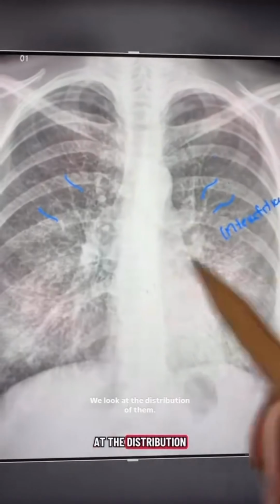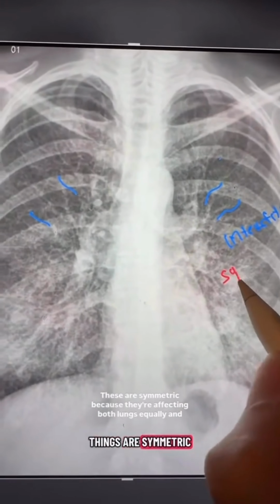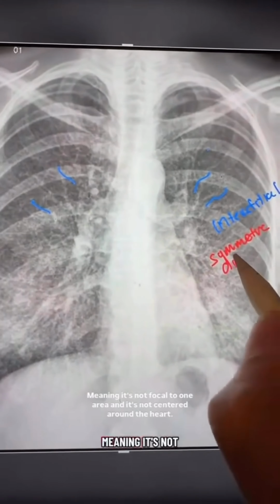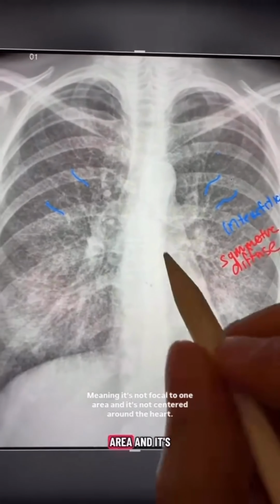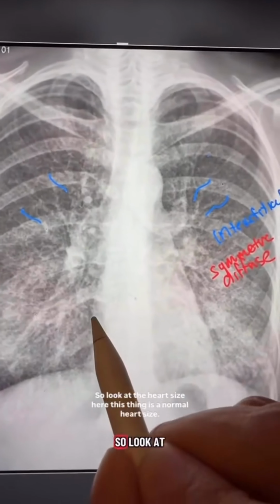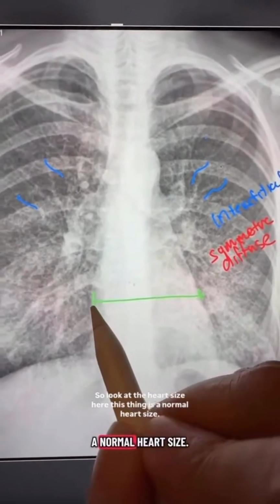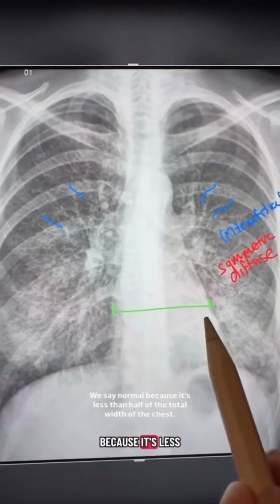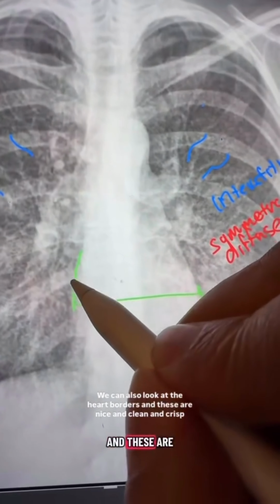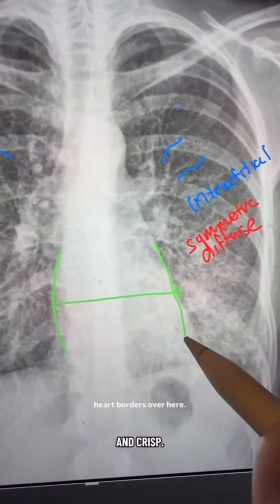When we look at the distribution of them, these are symmetric because they're affecting both lungs equally, and diffuse, meaning it's not focal to one area and it's not centered around the heart. Also have to look for the rest of the context clues in this case. So look at the heart size here. This is a normal heart size. We say normal because it's less than half of the total width of the chest. We can also look at the heart borders, and these are nice and clean and crisp heart borders over here.